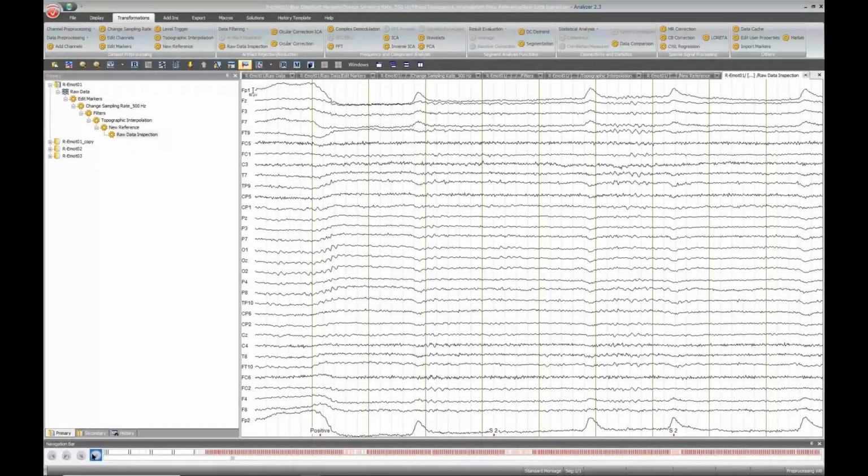So with my current criteria, it removed some of the data in the analysis section because some of the blinks were large enough to reach the criterion. So we could modify this or use another rejection criteria. But right now, I would decide that I will take this trade-off because I know also that I have many trials that I can leave still for analysis. And when I want to replicate this processing later with other data sets, this automatic manner will be much faster.